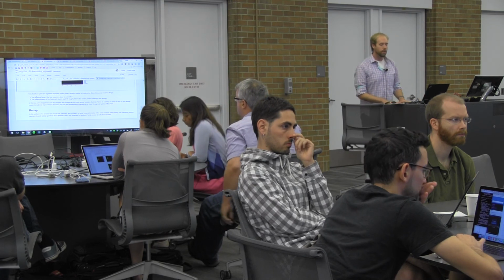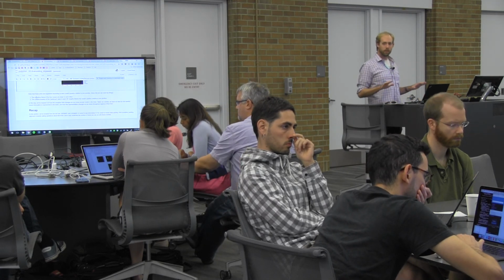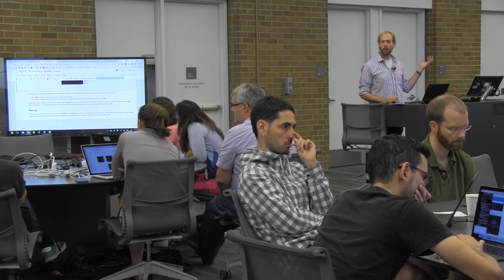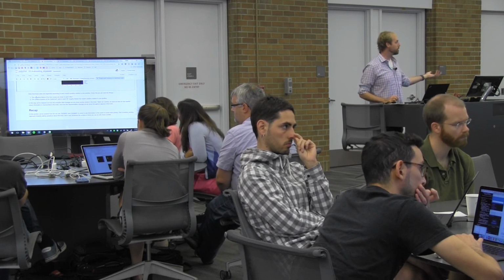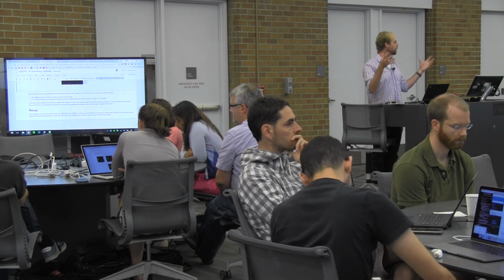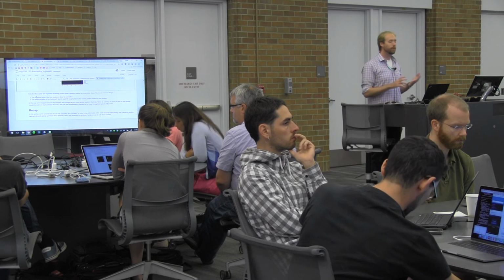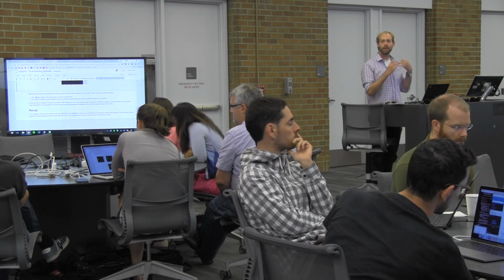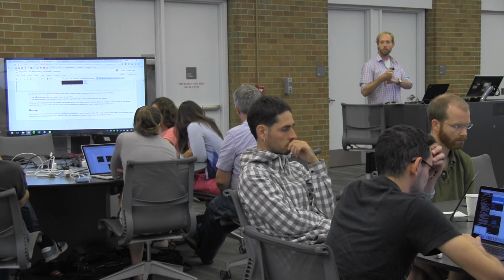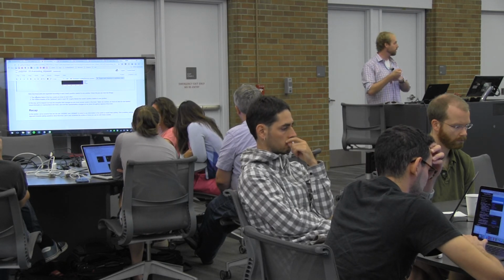Okay, so just to recap everything that we've talked about here, we began by talking about how you can go from neural activity that's stored on disk and read it into memory in Python so that you can incorporate it into the neuroimaging stack. Then we talked a little bit about how you can connect that neuroimaging stack with the machine learning Scikit-Learn stack in Python using things like a NiftiMasker.